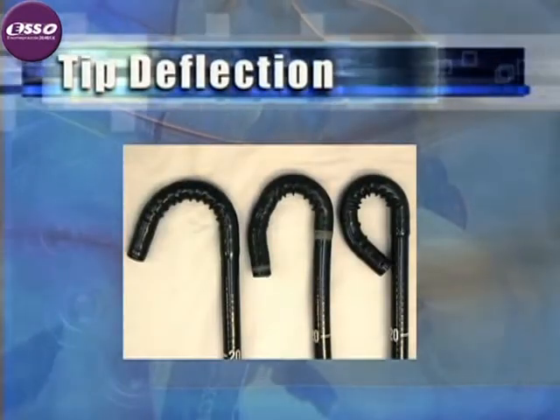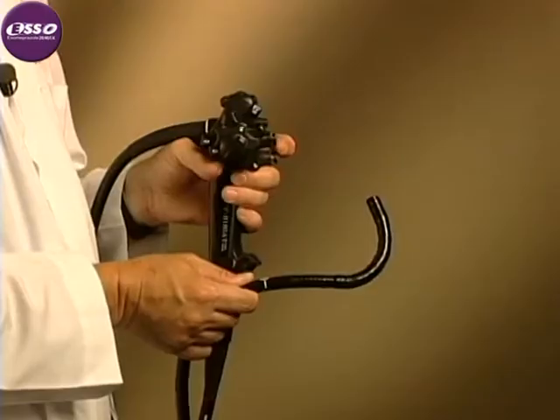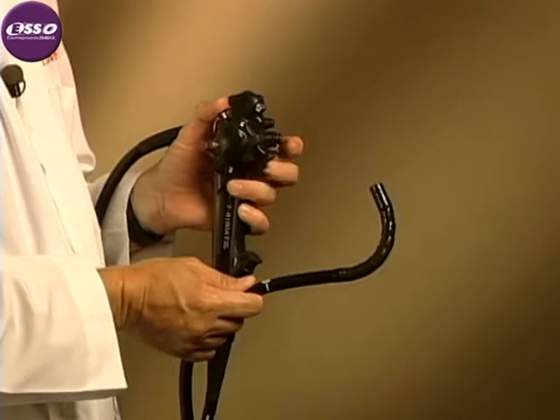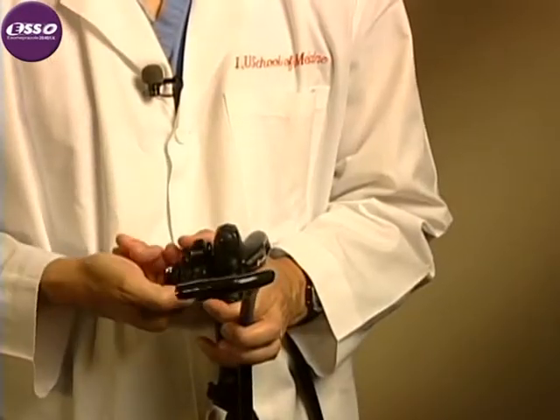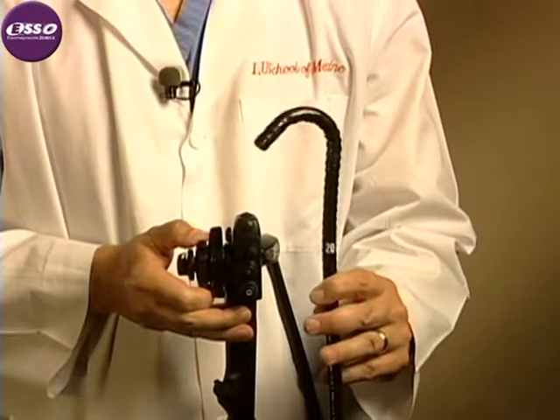Before we begin colonoscopy, we must understand the operational features of the bending section, which directs the tip of the scope through the colon. Commercial colonoscopes essentially all have the same deflection properties when working properly and will allow 180 degrees of bending in the up direction and 180 degrees in the down direction. Right-left maximum deflection is 160 degrees in both directions.